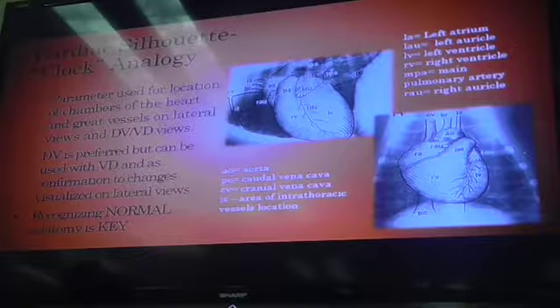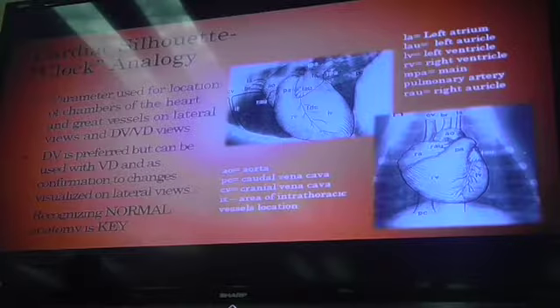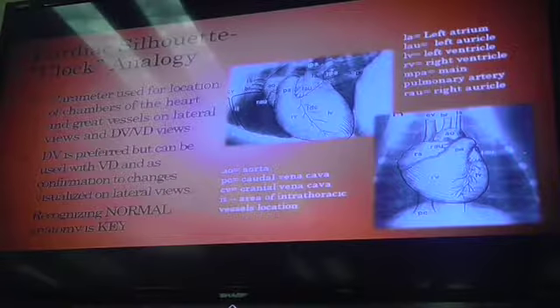If you're dealing with cardiac cases, you do DVs so that you get your minds prepared for that. If this is something otherwise, then VDs are okay to do. But if your technician goes in there and accidentally throws you a VD, because that's what they're used to giving you, don't chew them out, don't chew their head off yet. Okay? Just bear with them, because you can still make your assessment off of that.